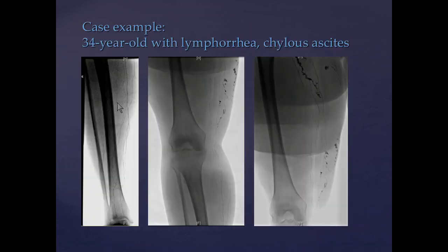My final example here is this person who had a really unusual condition that I hadn't encountered before, and that is she had chylous lymphedema, but interestingly, she also opened up these small vesicles on the skin in her right thigh, and she would weep milky fluid for days on end, and then they would sort of dry up. And you can see, again, normal peripheral lymphatics. You get up to the knee, stuff is clearly not normal.